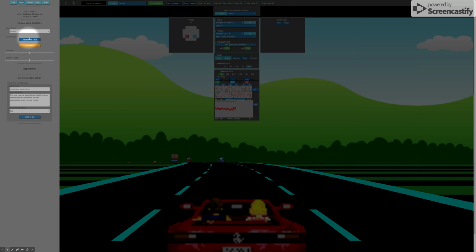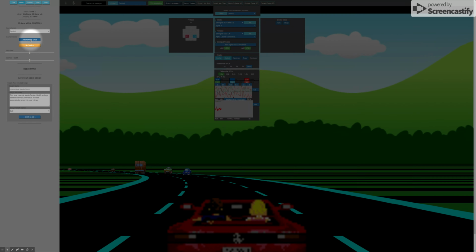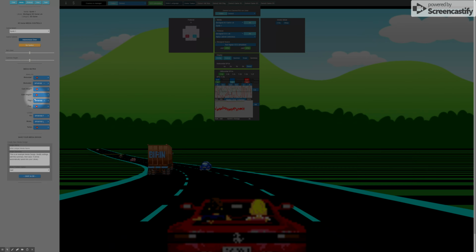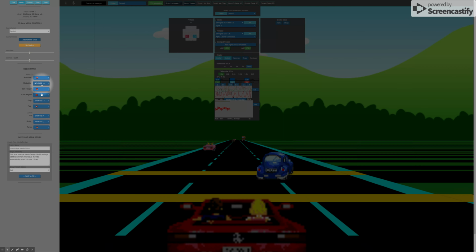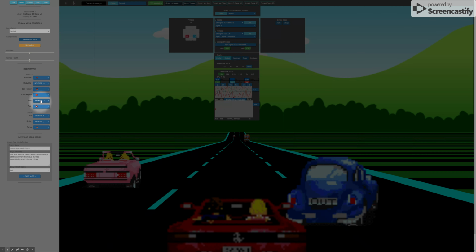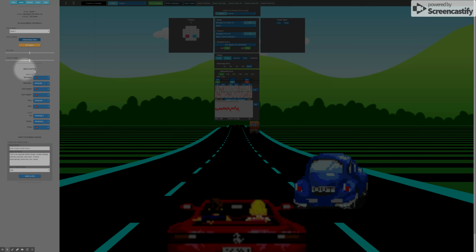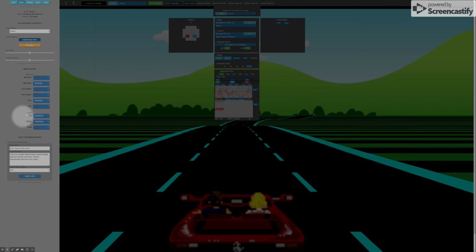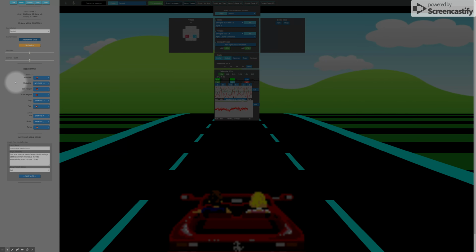There are other controls as well as to whether you want to fully drive the car or whether just drive the car to avoid traffic ahead. Other controls as well. Media matrix, very important. It's the connection between the protocol and the media, and how you want it configured, such as if it were video, you might want the video size, or you might want the video brightness. Those sorts of controls are adjusted under the media matrix. Here you can see that we're modulating the speed and we're controlling the fog. Go and break as well.